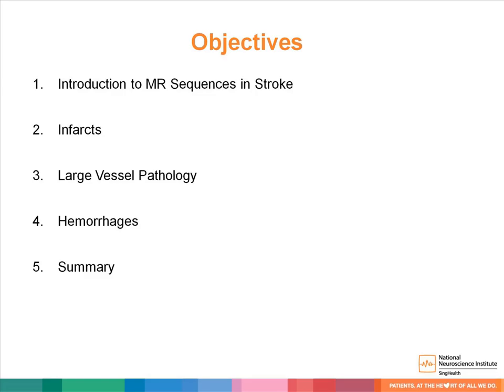The content for this presentation covers the following topics: a brief explanation of the magnetic resonance sequences used in stroke imaging, establishing the presence and age of infarcts, identifying large vessel pathology, assessing for hemorrhages, and a summary of the above.